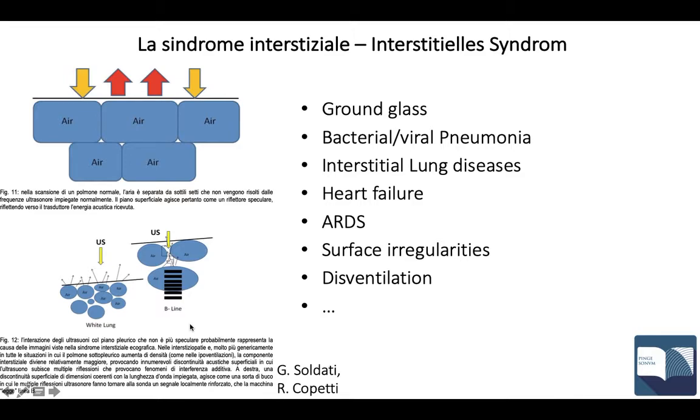These signs are aspecific, so they can be given by ground glass, by bacterial or viral pneumonia, by interstitial lung disease, heart failure, ARDS, surface irregularities, or a disventilation. So we have to read this information in the clinical picture of the patient with laboratory, symptoms and so on.